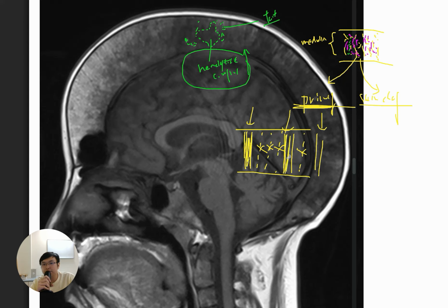So this is the most confusing part. On one hand, you know that there should be some marrow expansion, then the trabeculae should be broken. Then why do we still have this hair on end? Why are they not broken? They are even thickened. Because we are talking about different types of trabeculae.